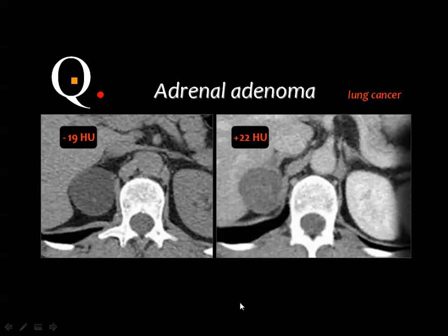Okay, and this is a regular adenoma because of the density in the pre-contrast.